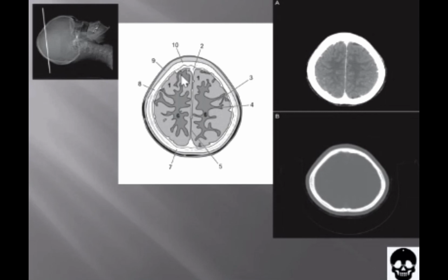All the drawings have been done according to the same gray scale. Regardless of where they are found in the body, air is depicted as black, bone is white. Within these extremes, shading varies for tissues, organs, and abnormalities. Each cross-sectional image is also accompanied by a reference image to help the reader imagine its location in the body.